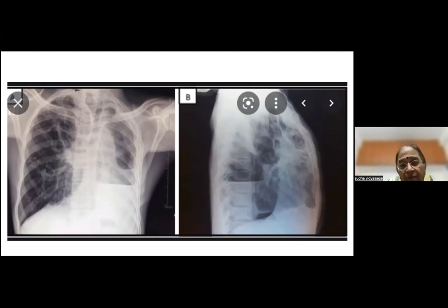Many times when you have an empyema, you tend to develop adhesions like that, and then they will all loculate like that. And so you can have multiple of these things. To call it a lung abscess, it doesn't look like a real proper cavity. The shadow is vague. There's no round shape here. It's all vague shadows. So I would probably put it down as an empyema or a pneumothorax with multiple loculations.